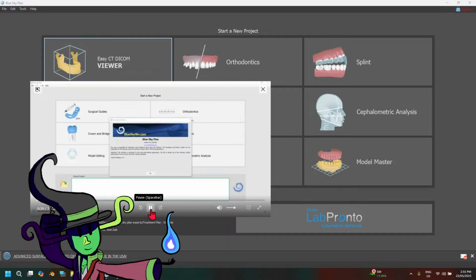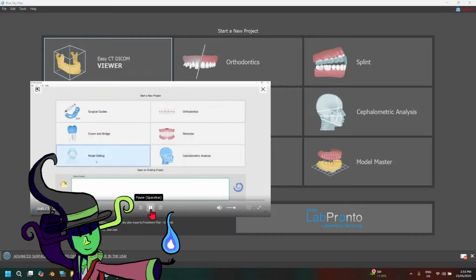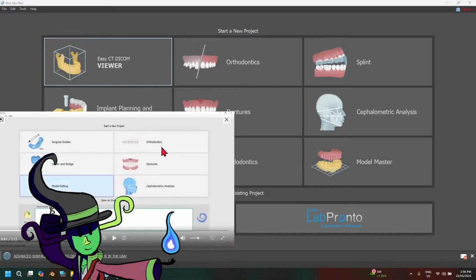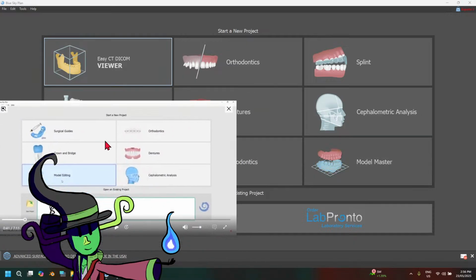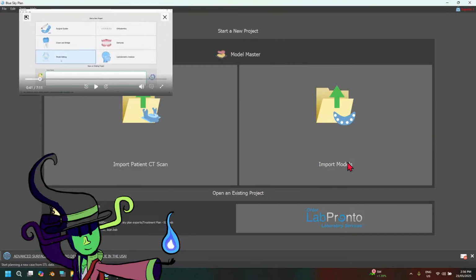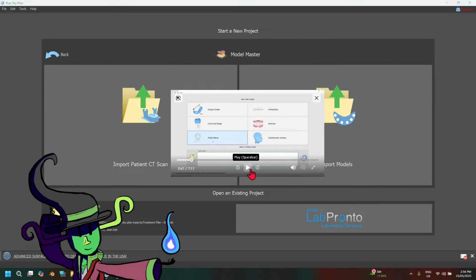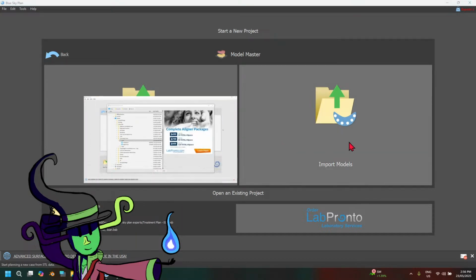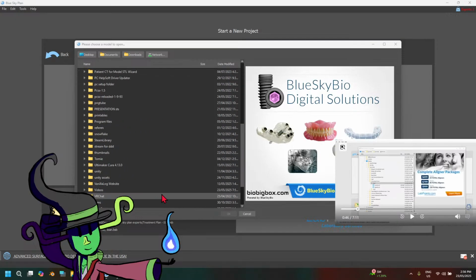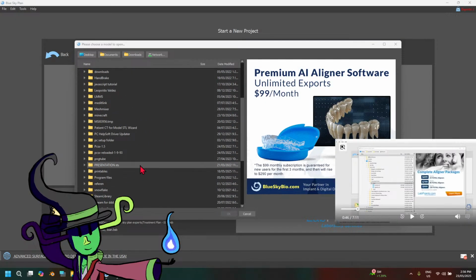2.5 credits remaining right now. Let's check this out. Okay, so I think this guy could click the model editing, but since we're in 4.13, I think what we're actually going to be clicking here is the model master. So I'm going to drag this video here, click on model master. Model editing, import models. Let's import the model. The liner package.